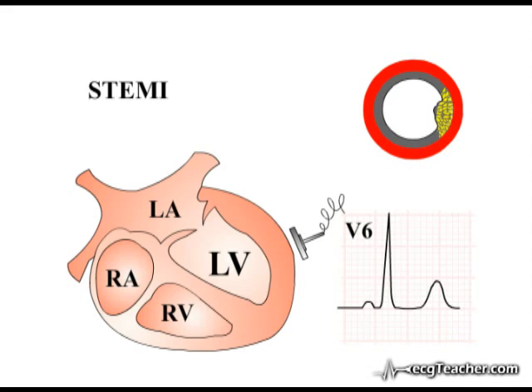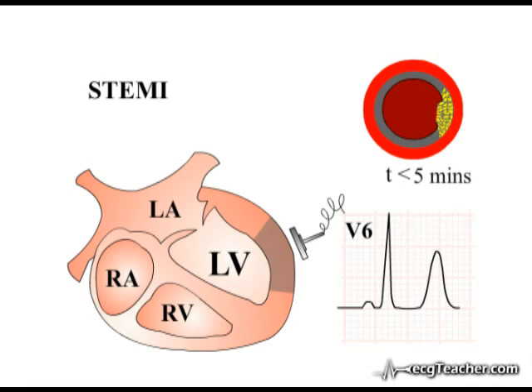You will remember from section 1 that normal T waves tend to be slightly asymmetrical in shape and less than 50% of the height of the preceding R wave. Within the first few minutes of complete vessel occlusion, T waves in the leads overlying the affected area rise in amplitude. The mechanism underlying these hyperacute T-wave changes is unknown.